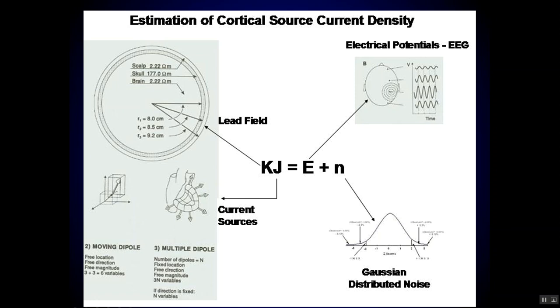as you can to where you think the epileptic focus is, and then the program will do a min-max operation to move it closer to try to maximize the current vector for that voxel or a set of voxels where the epileptic foci is. So with the discrete solution, you're looking only for one or two solutions.